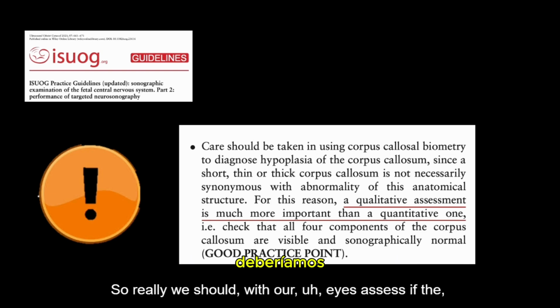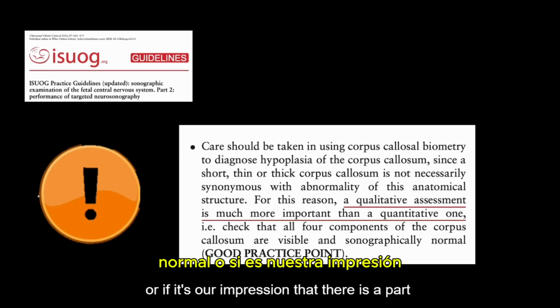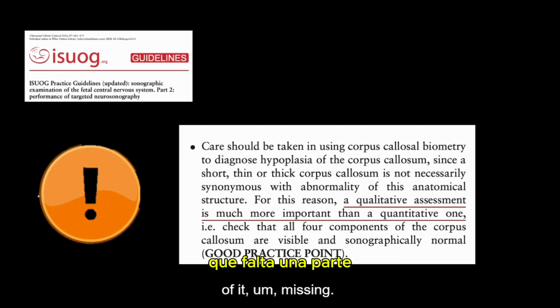So really, we should assess with our eyes whether the corpus callosum is normal, or whether it is our impression that there is a part of it missing.